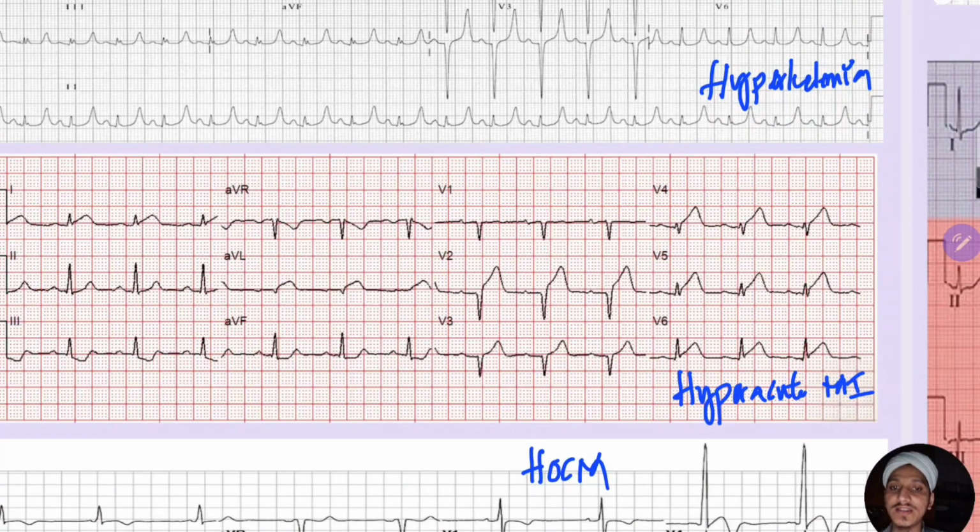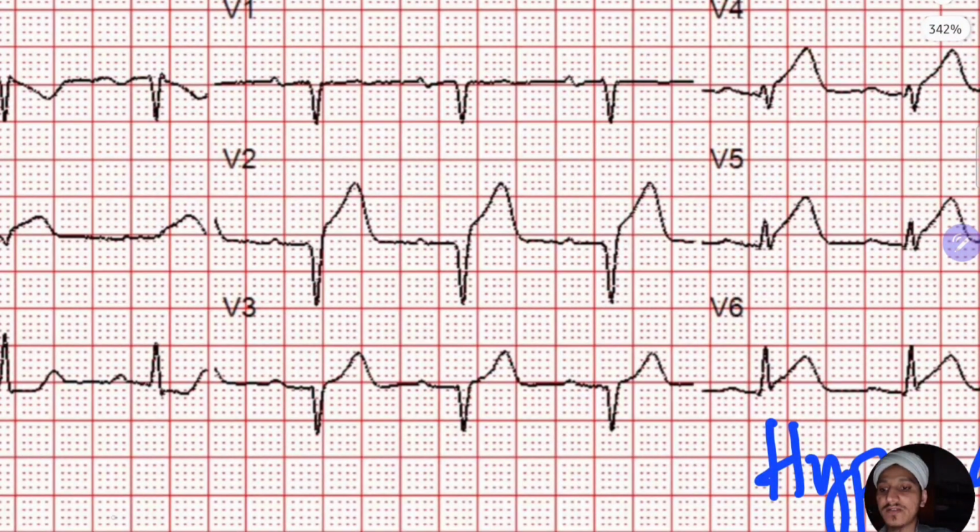So you can see here this T wave, V2, V3, V4, V5, V6. Okay, aVL you see and lead 1 you see. Okay, so these are tall T waves. So in precordial leads there should be at least 10 mm. If you take it from here, approximately they are 10 mm. You can't say, it looks like 9 mm. So they are approximately 10 mm.